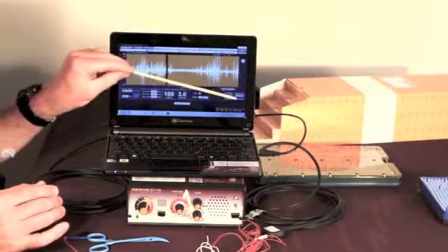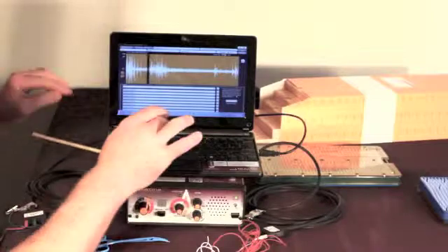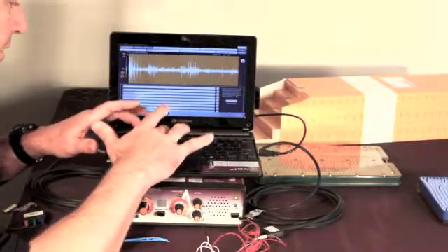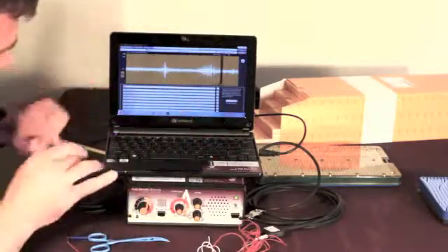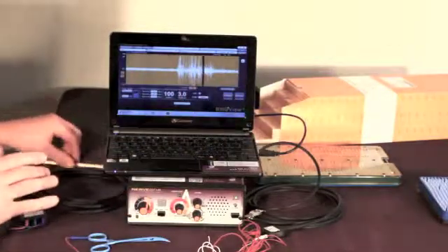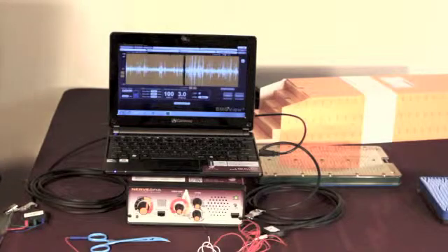Additionally, if I want to place a comment, let's say for example that I did a test stim, I type the note in there, hit the return key or enter, and that comment has now been recorded in my playback file that I am recording here on the EMGView software.